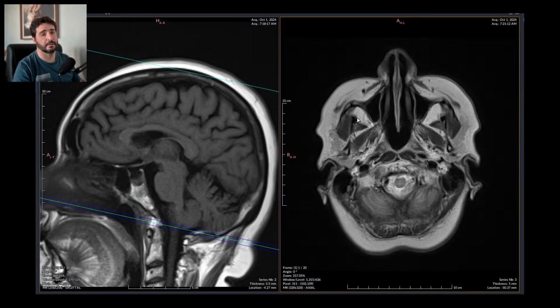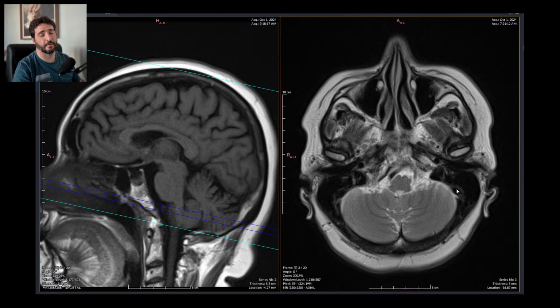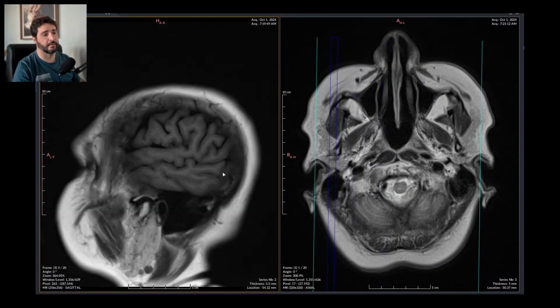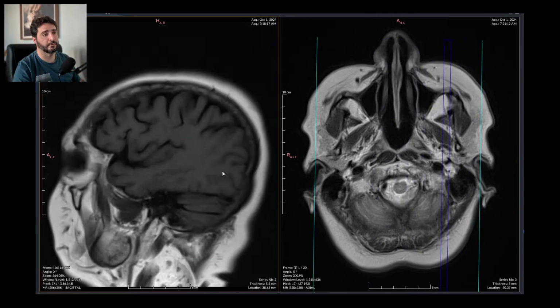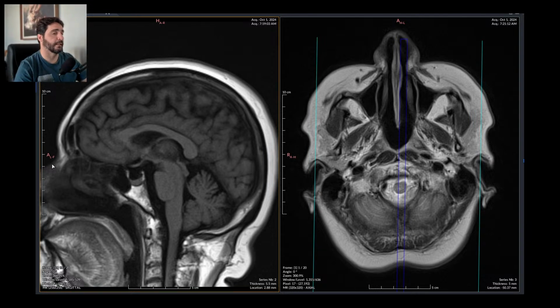I have seen worse. This is an axial T2. It's shaky. It's filled with noise. Bad. It's usually a very bad head coil. Old coil. Partially ruined. But they still use the equipment as if it was properly functioning.